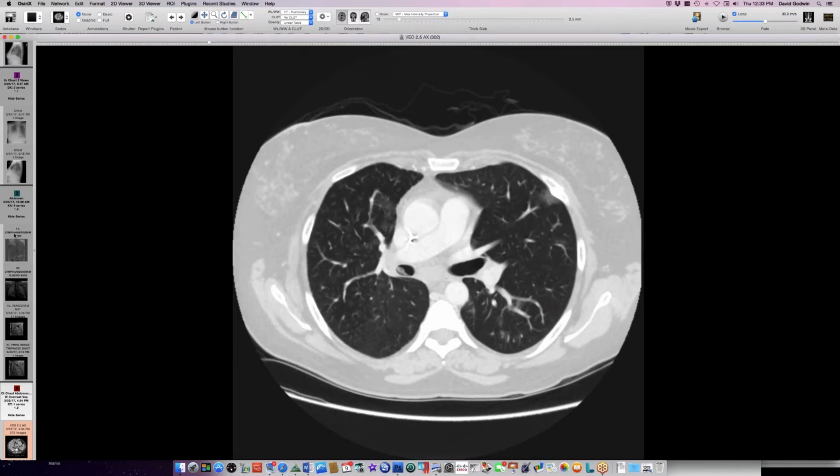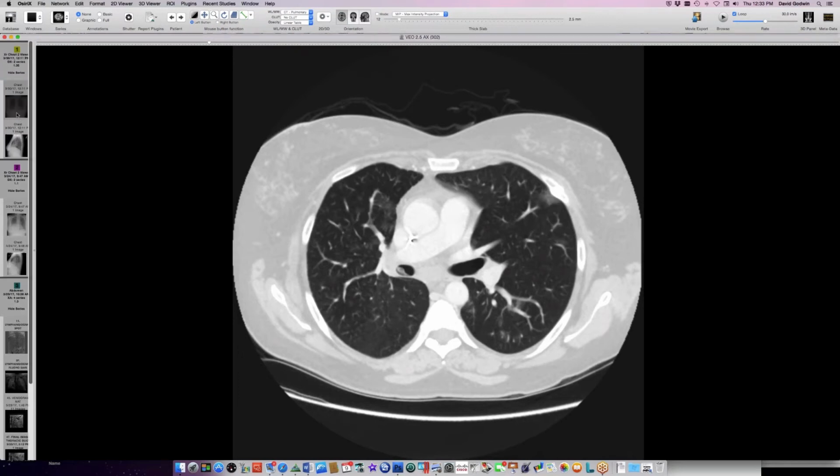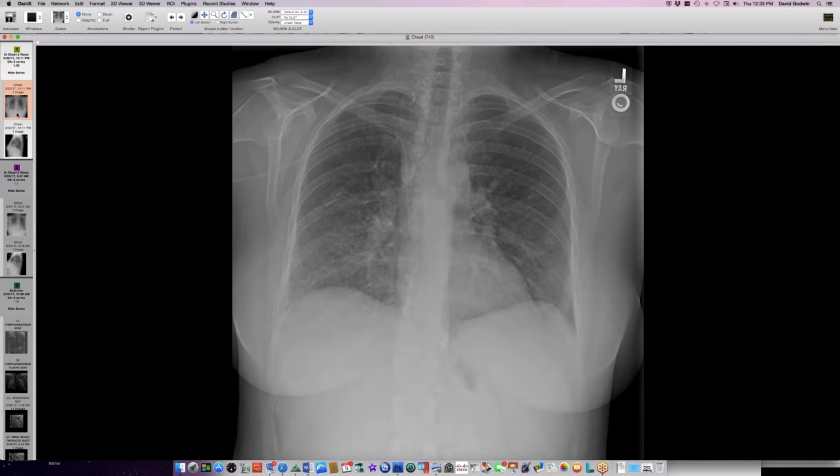She was headed to another hospital to get another procedure where they might be successful. This is one of her last radiographs, and you can see her lung disease had partly cleared. The effect of the lymph angiogram is sometimes to cause enough sclerosis that the lymphatics shrink down and she wouldn't have all of this lymph fluid going into her lungs and forming these plugs.